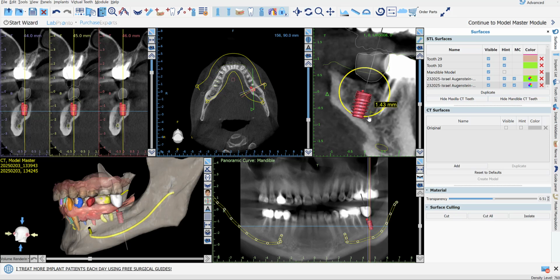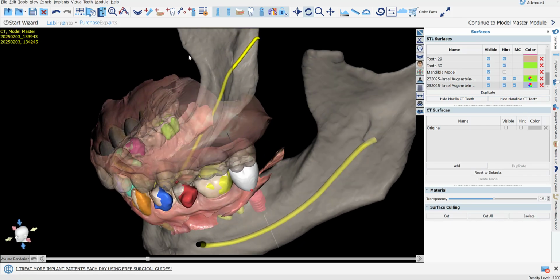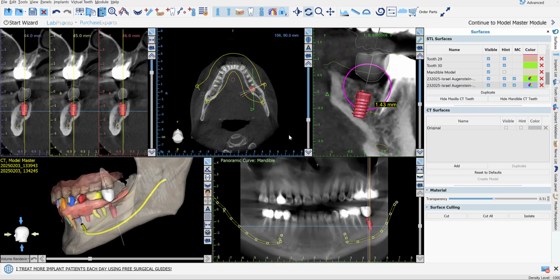Actually, now I can straighten that up because I've got my depth just by pulling it back. There's my exit for my screw retained crown. And now without thinking during surgery, I know my implant's going to drop exactly where I want it to go.